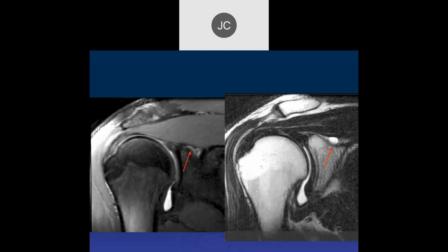These can often extend close to the suprascapular or spinoglenoid notches. Over time these cysts can grow and become quite large and compress the suprascapular nerve, producing denervation changes of the supraspinatus and/or infraspinatus muscles, which you always have to look for. So that's another type 2 SLAP.